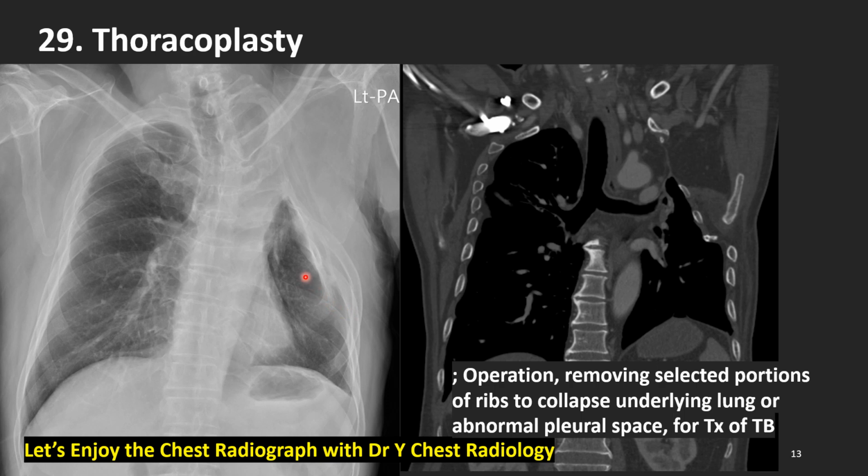Have you ever seen this kind of image findings? He is an old man. His spine is deformed and the left upper lung zone does not look good. Several ribs are retracted or not visible here, not original form, and the left upper lung zone was collapsed. His right side is okay. Right side diaphragm, right side hilum is okay, and left lower lobe seems to be relatively okay, but the upper lung zone is very deformed and collapsed.